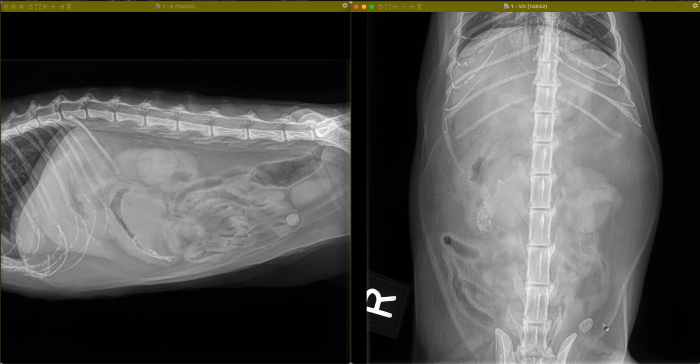In the left caudal peritoneal space, we see a smoothly marginated, thinly walled mineral structure that's consistent with a Bates body. The liver is a little enlarged, extending beyond the costal arch with a rounded margin. We also note that there's a little bit of fine fat stranding or soft tissue stranding amongst the fat.